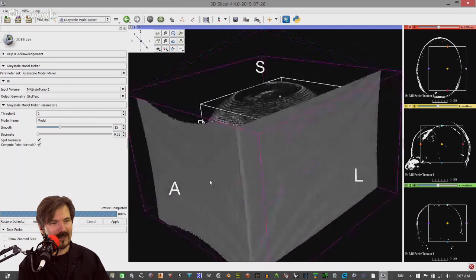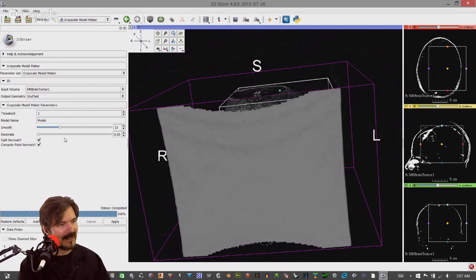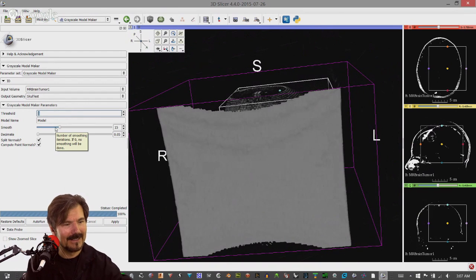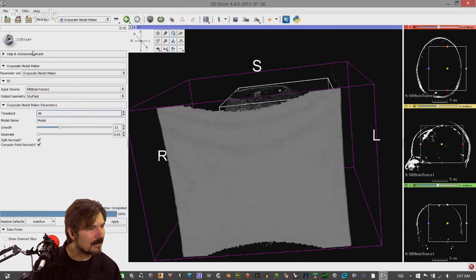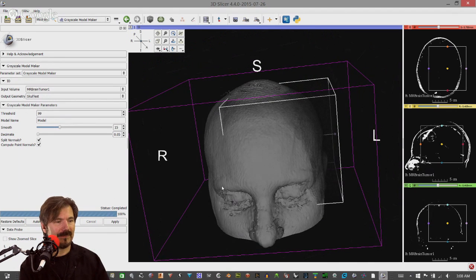That's kind of, oh, look at our model. It's there somewhere. You made a box. Made a box. But why is that? Well, does that have anything to do with the threshold back at 99? Well, let's see what happens. We can play with that. Well, it's taking longer. There you go.